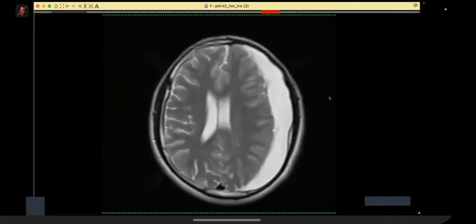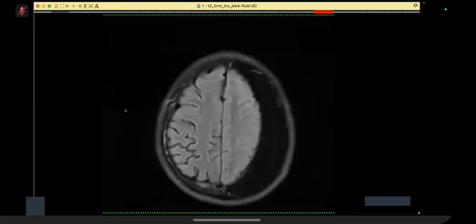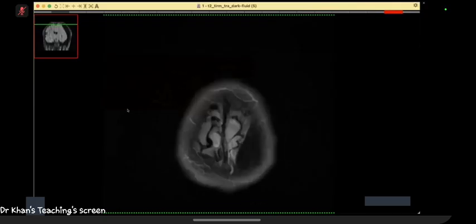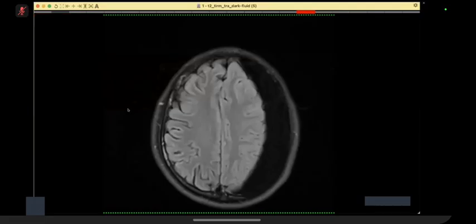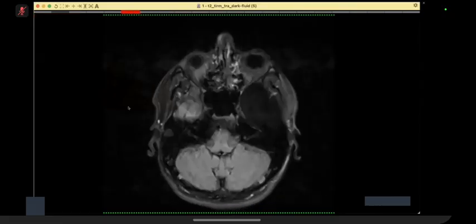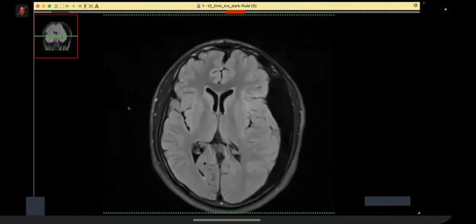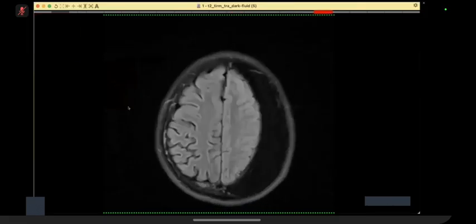Okay. So can I see its FLAIR image, please? Yes, please. I'm scrolling for you. Okay. So this extra-axial space follows the CSF on the T2 as well as on FLAIR sequences. It's causing mass effect on the brain parenchyma. Can't see any parenchymal abnormality. There's no hydrocephalus.